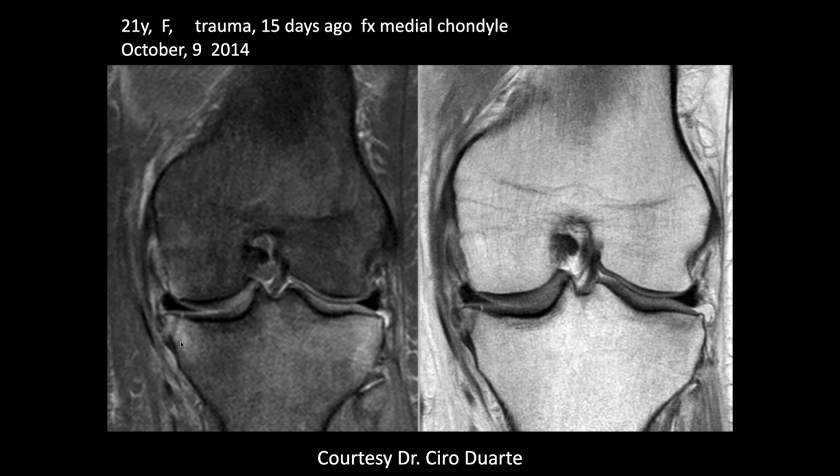History. Okay, so here we can see that there is a little fracture here on the condyle. The condyle is misspelled. Well, I didn't spell that. That comes from Ciro Duarte. That's the way they spell it in Brazil. So we can see that there's a little fracture here.